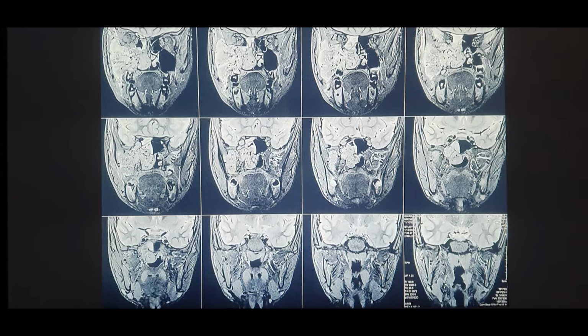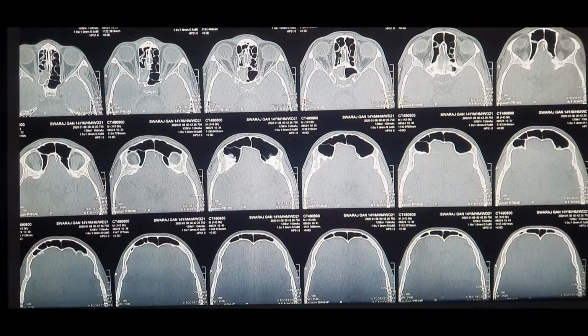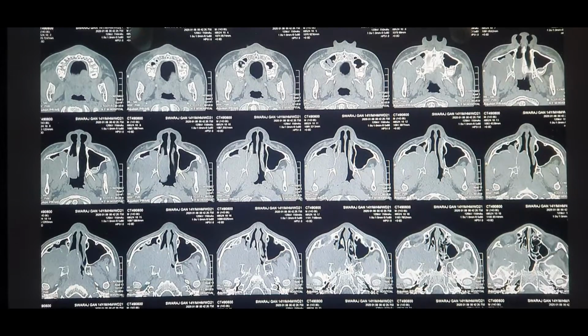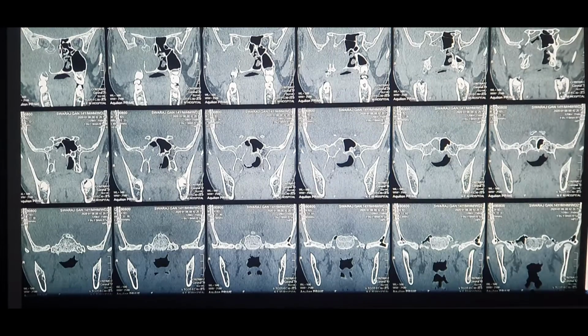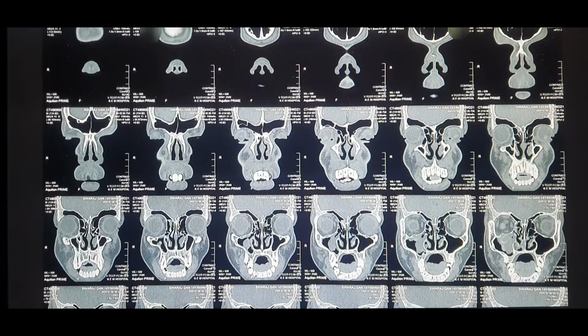Primarily we do a CT scan only, be it contrast or plain, but sometimes, in cases where the mass is originating in the sphenopalatine foramen and invading the cavernous sinus, it may also invade the intracranial cavity or the orbit. In such cases we need to get an MRI as well for an even better study. So I'll begin with the CT scans first as the primary thing.